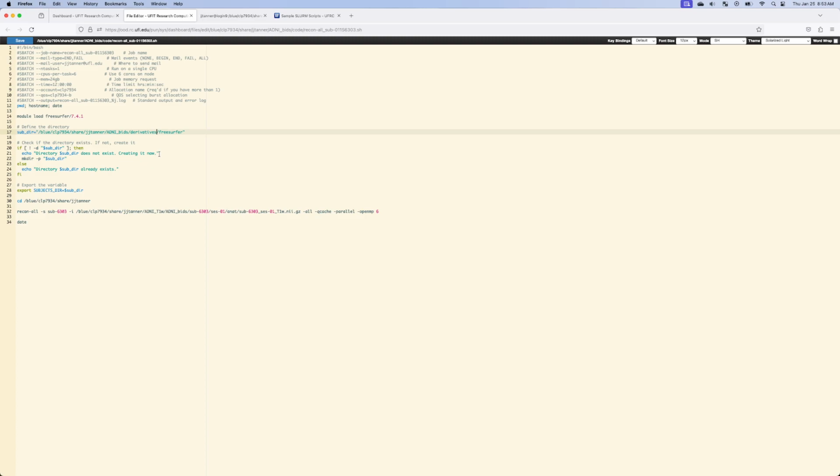Now we're going to do one thing. And what we're going to do is show you how to do that in the script. So you don't have to make the directory. I was showing you making it, so you can do that if you make it that way. Here's also how you can do it in the script.